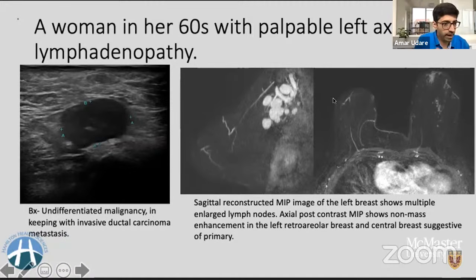So, no BI-RADS, by Rania Anand. I'm not sure if you are still going back to the previous axillary ultrasound image there, but I agree with you. There is no BI-RADS category for the axilla. But in this case, now once we complete our entire workup, this is highly suspicious for malignancy.